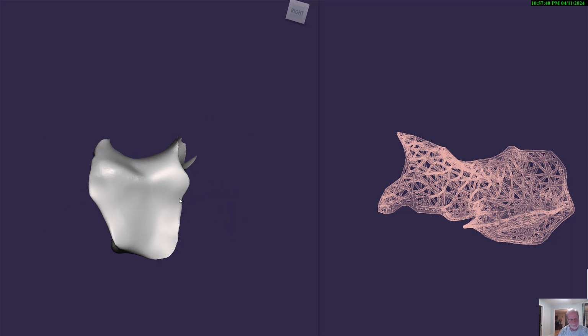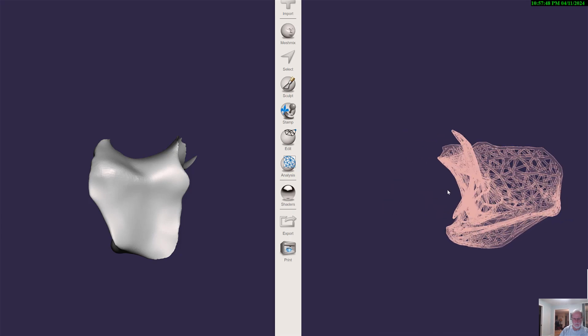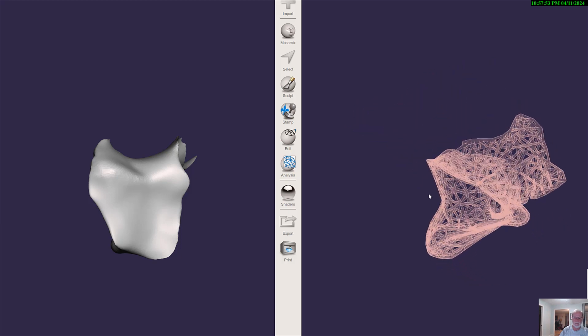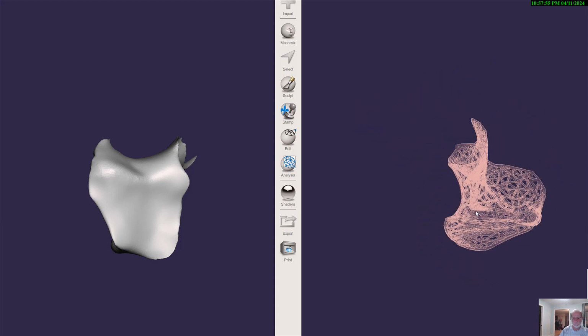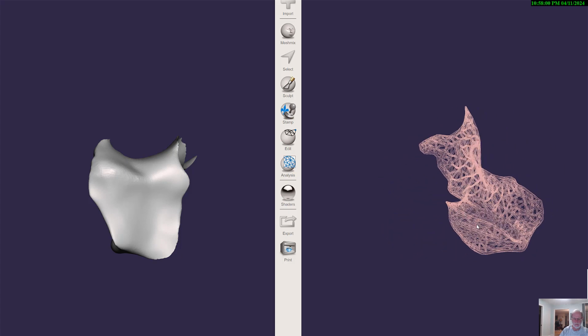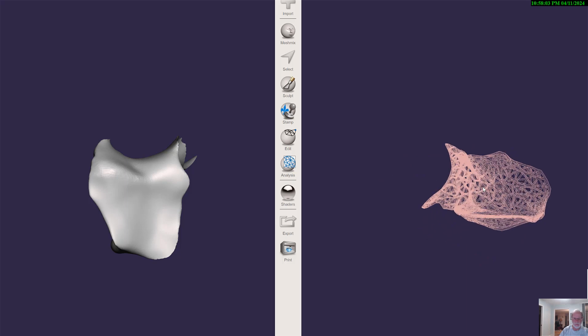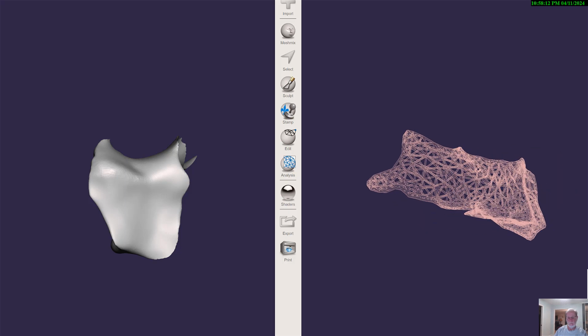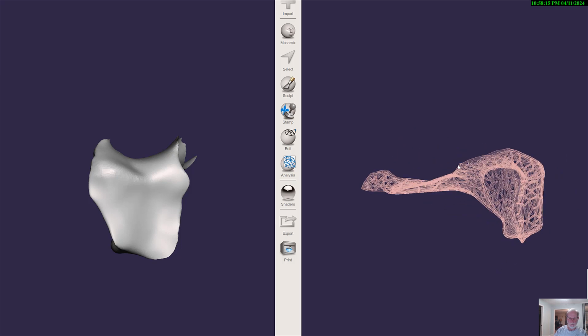Now what we can do from this solid STL file is make it into a lattice, as shown right here. And now you can have the same bone graft rendering, or virtual bone graft, made into a lattice that can be exported into any type of printer and be printed in hydroxyapatite or any resorbable material, which gives a much nicer way to produce a bone graft. Again, you can cut it right here and fill this with bone.